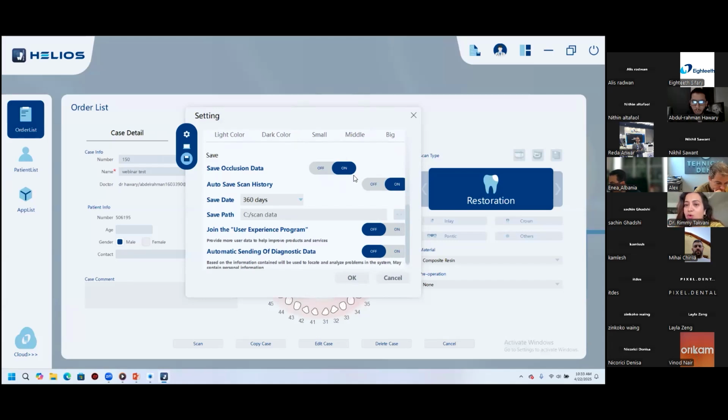So now, once it's uploaded, I can edit only the area where I want to edit? Like suppose I've done a full mouth preparation, only one tooth I want to modify, and I do not want to repeat the scan. You'll have to upload it again. It will not be edited within the cloud. You'll have to upload the case once more. Would you be able to show it to me? Yes, of course.